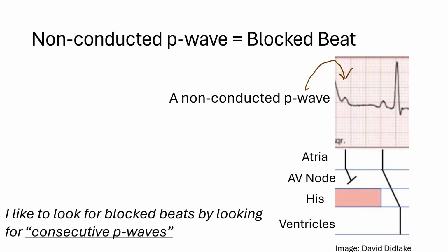The diagram I've just revealed is called a laddergram. It uses lines to show signal conduction and blockage at different levels. I will explain them in another video.